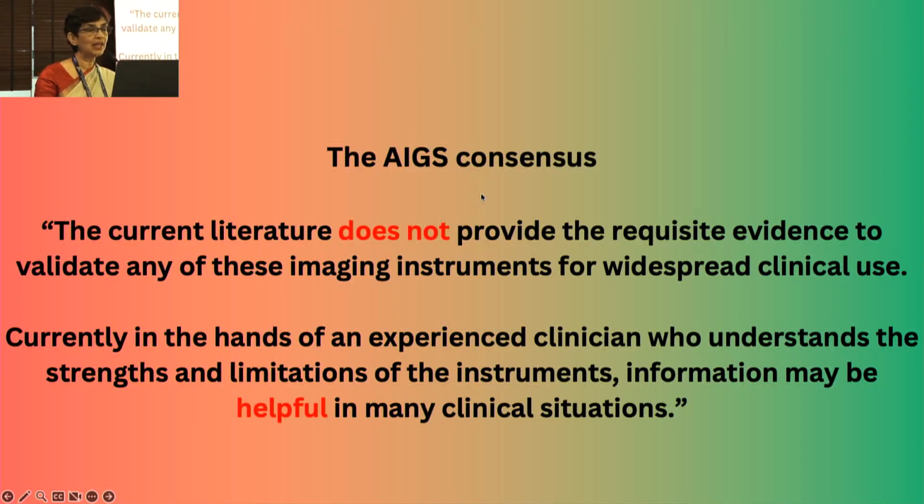And finally, again, I want to reiterate that the OCT is only helpful to make a diagnosis. You should have a complete workup of the OCT, just as you do for the visual field, and then you make a diagnosis of glaucoma only based on the history, on the optic disc, and the visual field changes. OCT is only a helpful tool.